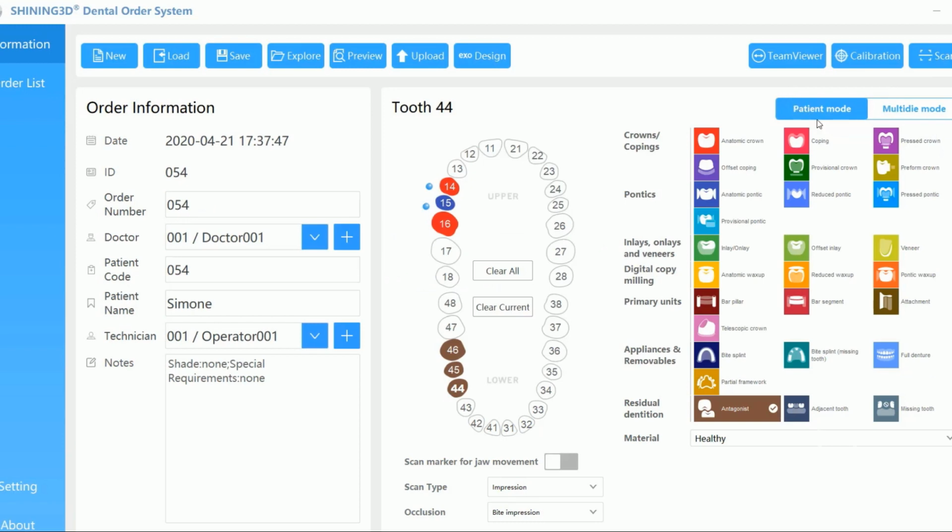Okay, before asking my colleague Filippo to start designing this bridge and to print it out with the AcuFab 1 3D printer, I would like to share with you the new amazing functions with the AutoScan-DS-EX Pro family of scanners.